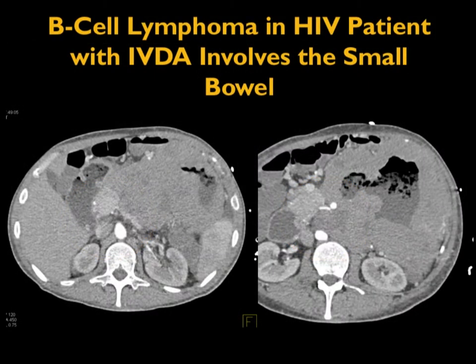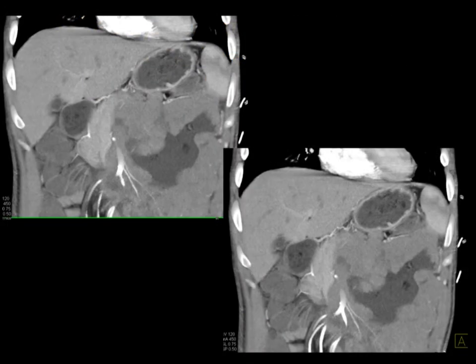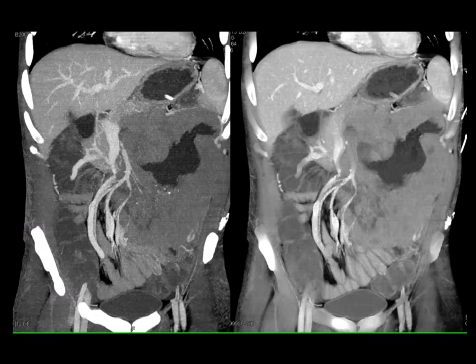Another example, in patients with HIV, the tumors are often very, very large. Look at the left upper quadrant. The whole thing is filled in by tumor, ulcerations, necrosis, infiltration, coronal view. Beautiful example of the large ulceration of the tumor. Full field of view images. Just extremely impressive how large, in fact, that tumor is. And that's a hallmark of lymphoma, though I have to admit, a GIST tumor, exophytic ulcerations would be a possibility.